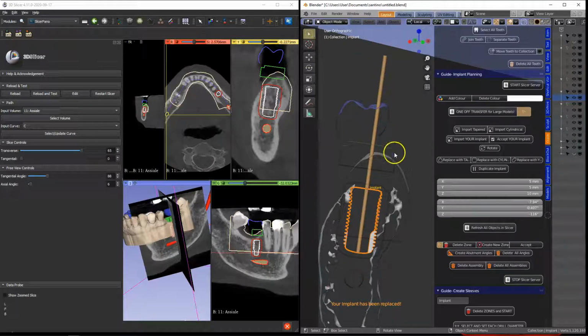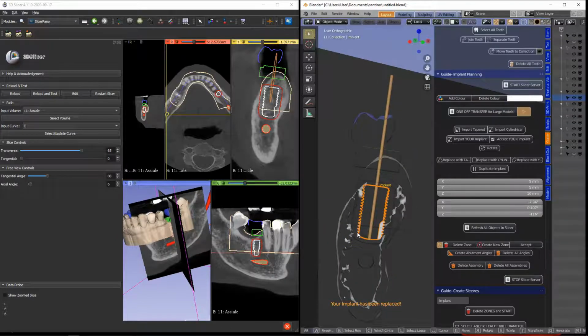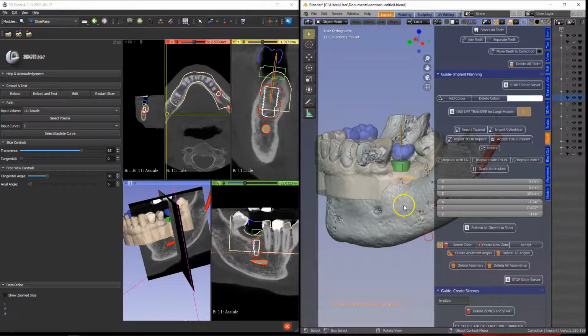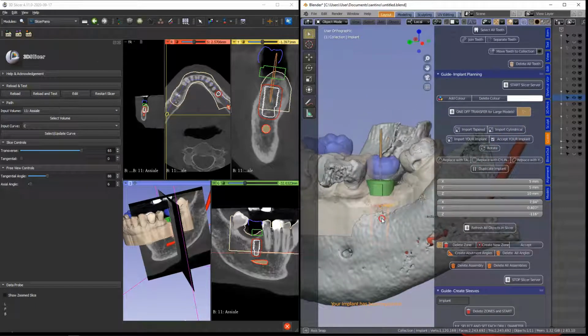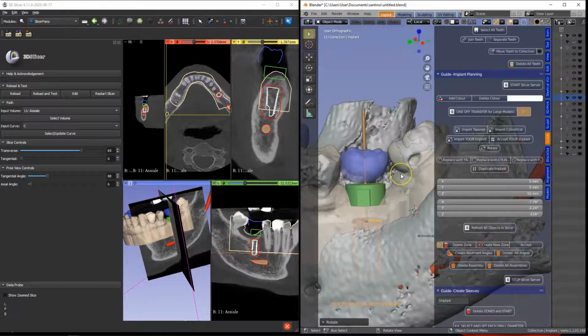Now assuming you are okay with this, again I'm not 100% sure, we can already see in our Dicom where this has been placed. This is a really good way of doing this. We can see there's a little bit of extra bone there, and we could move this across this way a little bit. So on this one, Alt B, I'll have a look, and perhaps we can move it a little bit across using the G key like this, and we could then even rotate it a little bit as well if we want to, something like that.